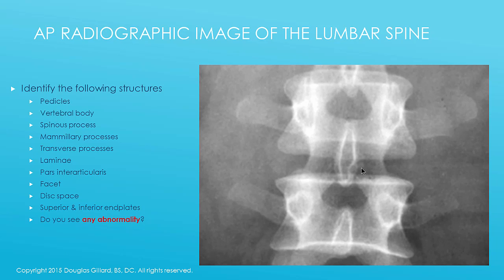Now we have a real radiograph, right? Let's go through this. So here's that interlaminar space that I talked about. Okay, here's a nice one on this particular picture. This patient has nice interlaminar space. Although really, we're still inside the body, right? Because now, what is an X-ray? An X-ray is different shades of.